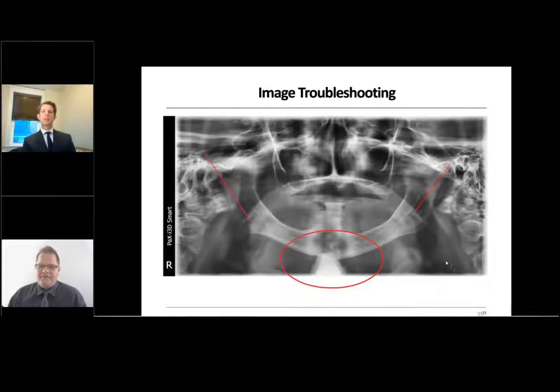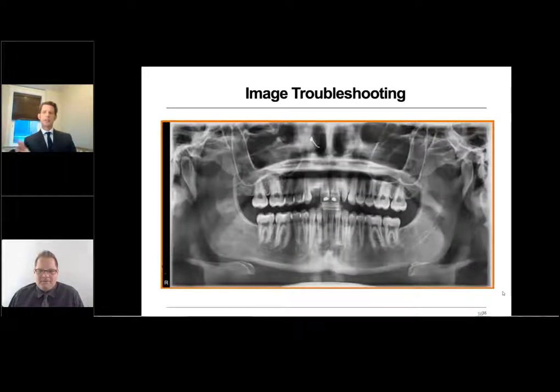Here again, the patient tipped up a little too high because we have the condyles flared out. Yeah. And the vest usually has a little bit of a dip in it to avoid that. Right. And then here's where we noted already where they did not have the tongue flat to the roof of the mouth. Yeah. On there. Yep. All right. And let's end, I guess, our troubleshooting with this image here. Really kind of ties everything together.